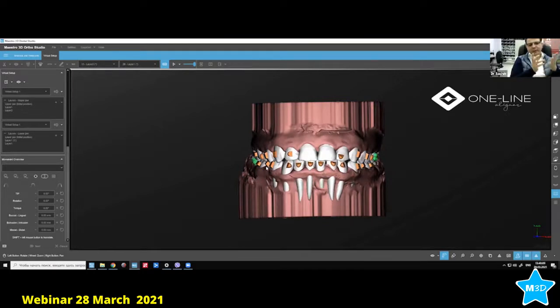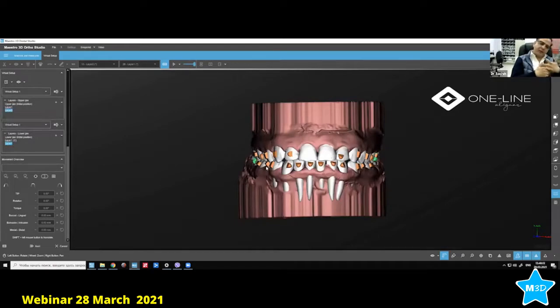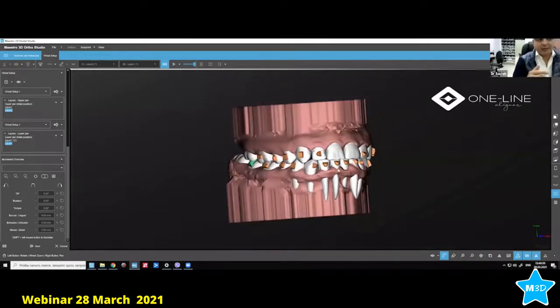Okay, so we can also talk a lot about what movement has to be done first, what can be done together, what cannot be done together, how it can be done together in case needed, what are the minimum requirements to do the expansion or the intrusion together. I think we need a different webinar for that. Right now, we will talk more about attachments. So I think in this case, you have understood why we have so many attachments? What did we plan here? And why did we plan here?